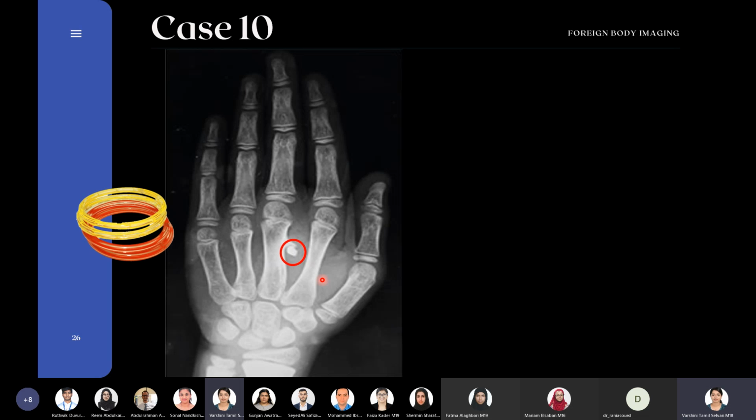And so basically what you have to take away from this slide is that this is called the extremity foreign body. And it's quite uncommon with regards to the other types of foreign bodies in other regions that we've covered just now, like with regards to the chest or the abdomen or the head or the neck. It's very uncommon to see foreign bodies in extremities, like in this palm.